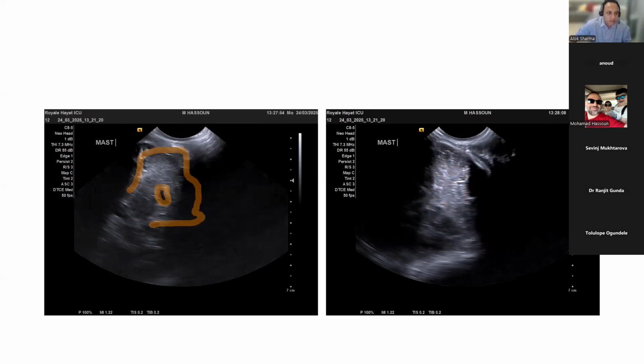And really, with your measurements, what you're doing is measuring from one end of the cerebellar hemisphere to the other to get the measurement in millimeters. And that correlates with gestational age. So if you have a 35 millimeter cerebellum in this baby at term, that would be appropriate. But if the cerebellum extended only here, then that would be an indicator of cerebellar hypoplasia.